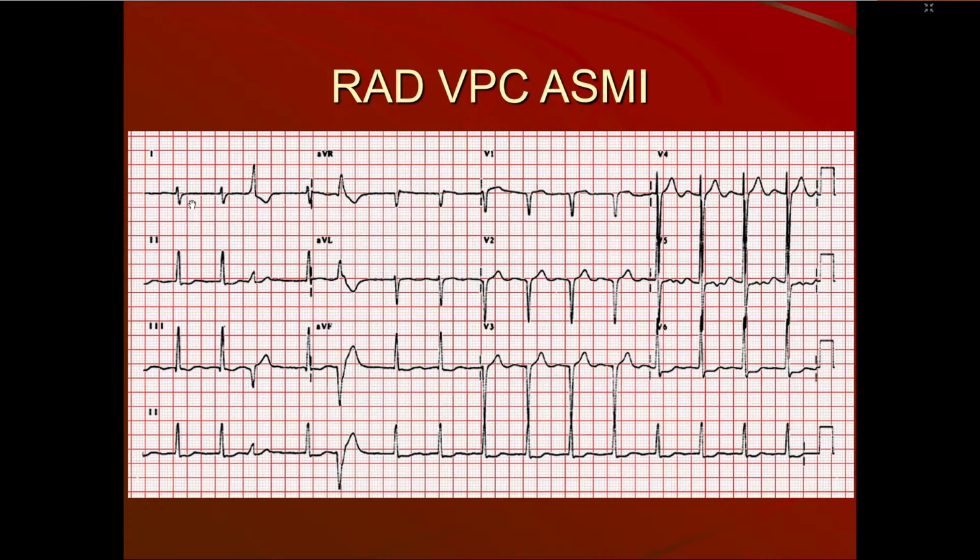So this is an isoelectric line. Let us say this is isoelectric in lead 1, lead 2 is positive. No S wave. Lead 3, no S wave. AVR, nothing is positive in AVR, nothing is elevated, so fine, good. So AVL and AVF. Now see, of the first 6 leads, only lead 1 you can classify as the isoelectric complex. So what is perpendicular to lead 1? Minus 90 or plus 90. Now look in AVF. AVF is positive, it is not negative. So in that circle, we'll place AVF at plus 90. So it is a right axis deviation.